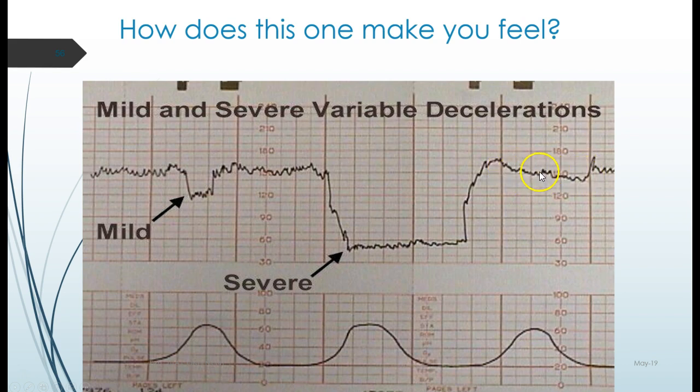Minimal right through here. This might be 5 beats per minute or 6. This, since I really can't call it, this I feel comfortable saying it's at least 6. This, not so much. Maybe that little bit right there means I'm going to have to watch this. The good news is it didn't happen again after this contraction.